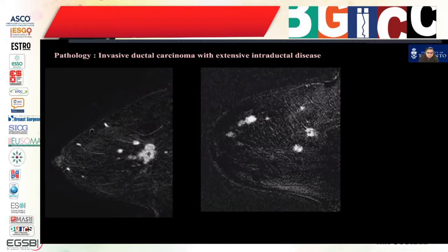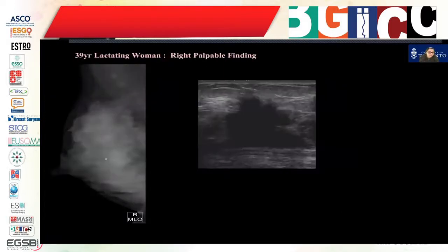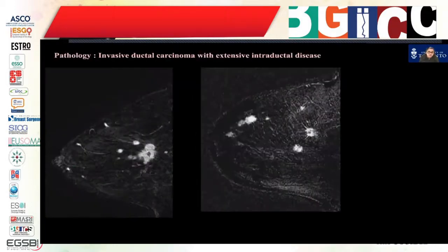So this is multicentric disease. Just based on these two images, you really can't offer her appropriate management, because then you are going to leave behind so many other enhancing spiculated cancer foci. This is the importance of staging: to know how much tumor there is, so that proper selection for breast conservation can be performed.